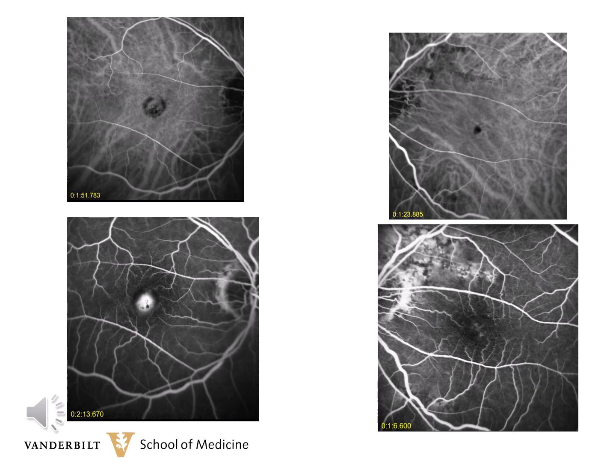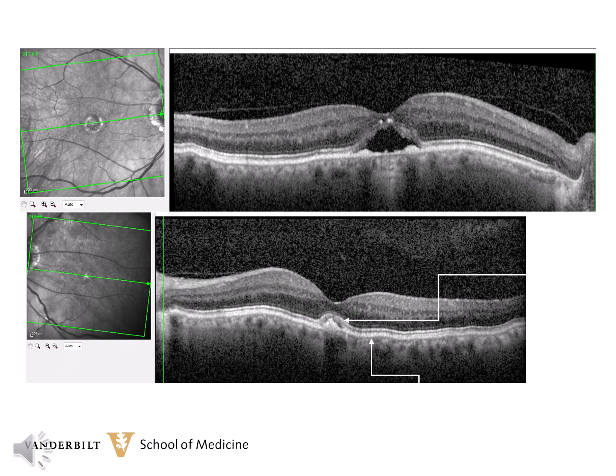Here is both a fluorescein angiogram and an ICG on this patient. You can see some hyperfluorescence centrally in the right eye and some diffuse and non-diagnostic changes in the left eye. Neither one has a typical pattern either of age-related degeneration or of central serous. But here, the OCT can really help and give you the diagnosis of pattern dystrophy.